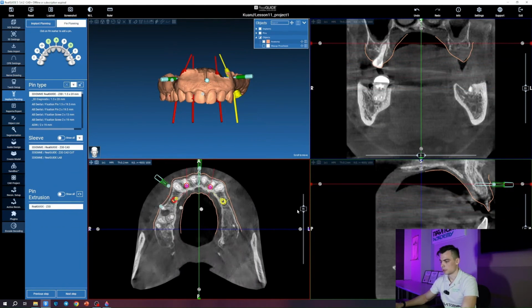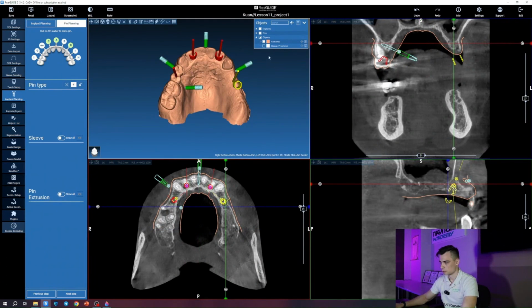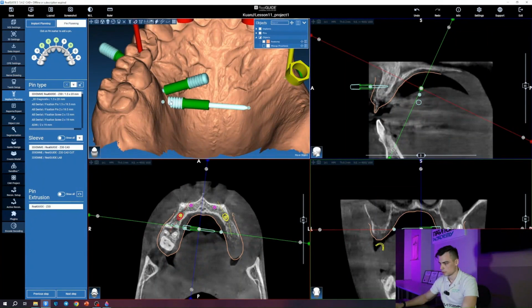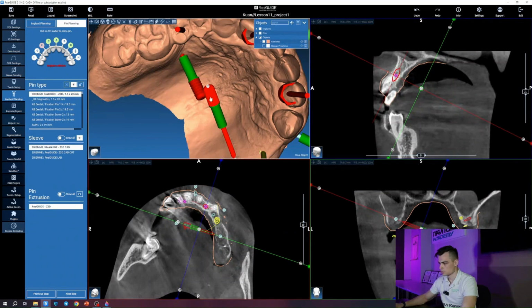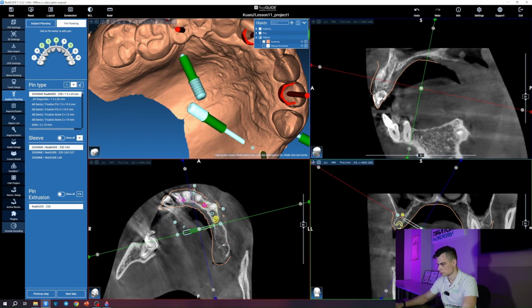And by the way, when you're placing fixation pins from the pallet, you always need to remember to make sure the fixation pins don't interfere with each other. In other words, there shouldn't be. Let me show you something like this. Hold on, just the other way. The mouse isn't cooperating. Basically, you need to make sure that you can actually place the pins, plain and simple, but the program will let you know if anything is touching or overlapping.